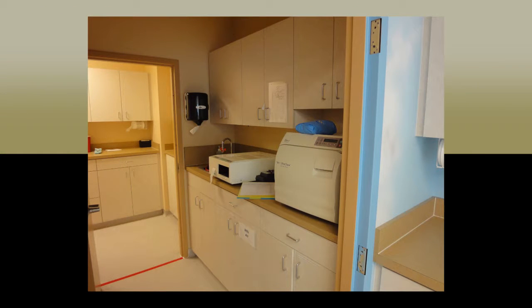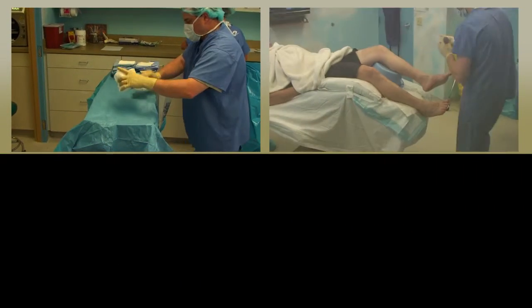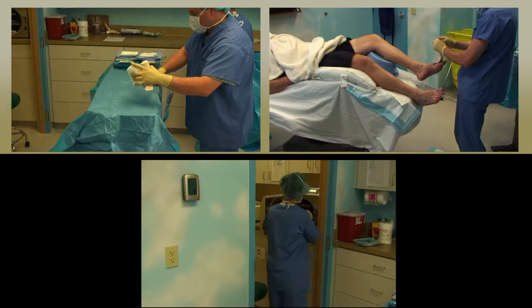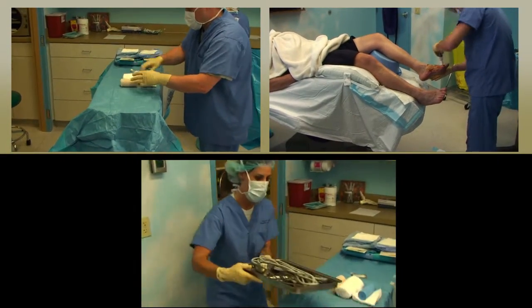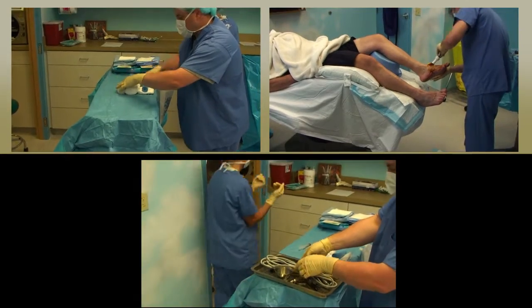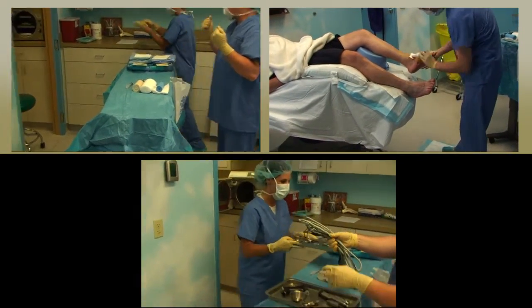While these items are being sterilized, you will then prepare for the next surgical case by placing a sterile field and prepping the patient as mentioned before. When the instruments have been sterilized, they will be ready for the following case, and each instrument set will be recycled throughout the day to ensure each case has a clean set of freshly sterilized equipment and supplies.